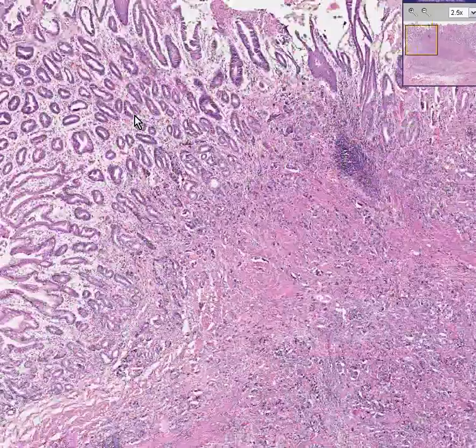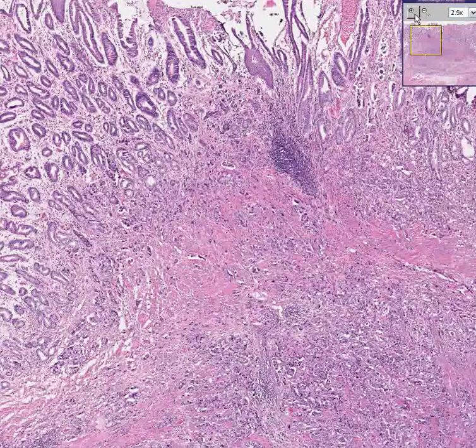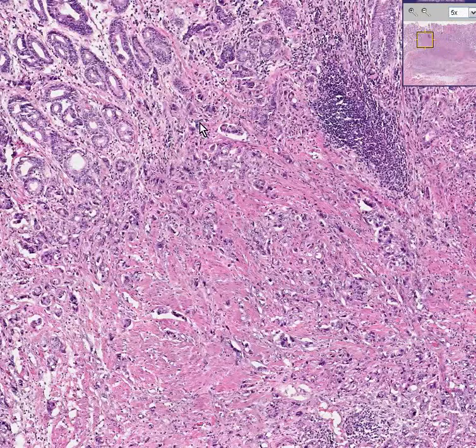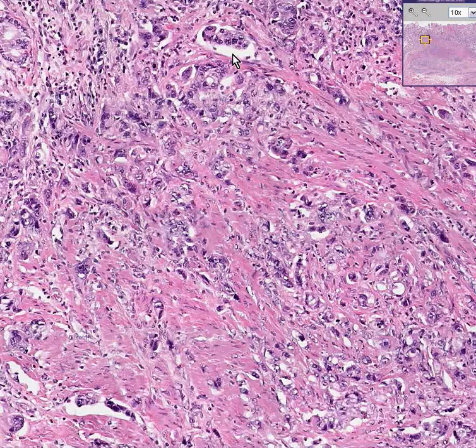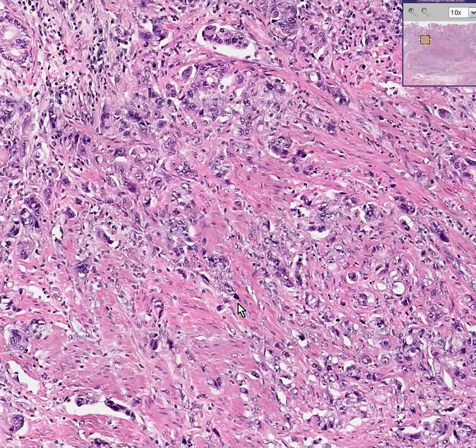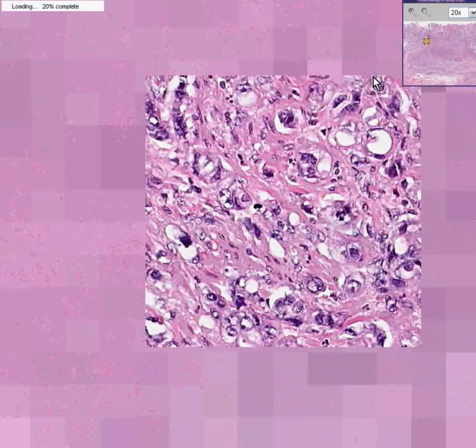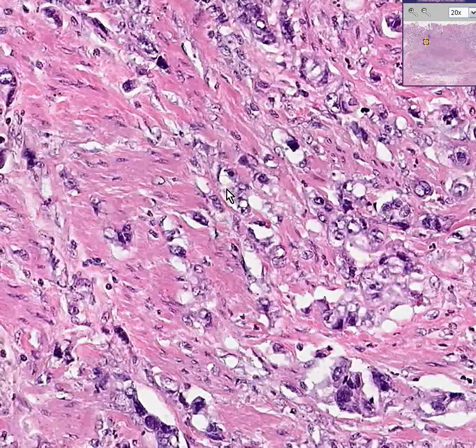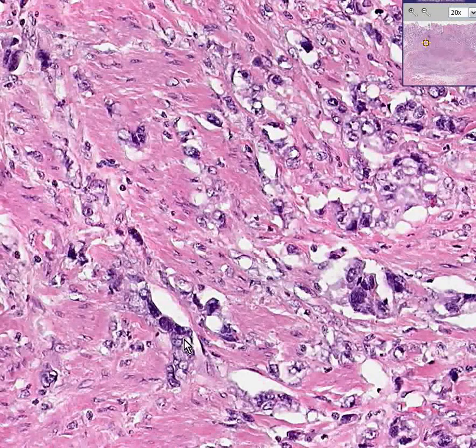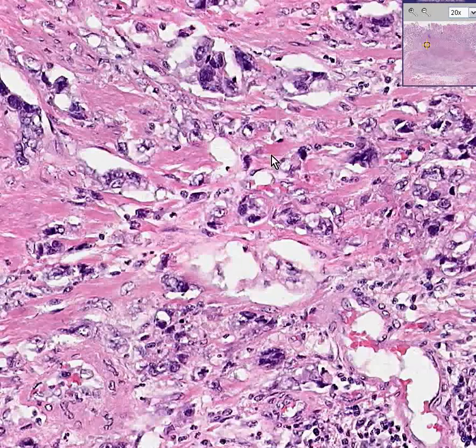However, as you go deeper, somewhere along the line, you could see these dark, irregular, and sometimes even abortive-looking glandular structures infiltrating throughout the smooth muscle of the esophagus, sometimes occurring almost as individual cells, sometimes forming what you might agree look like little haphazard glands, or what they call abortive glandular formation.